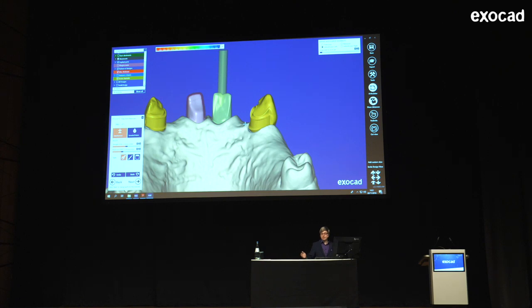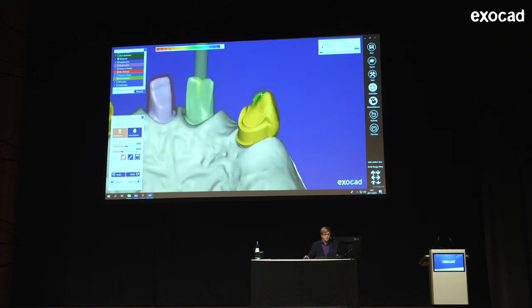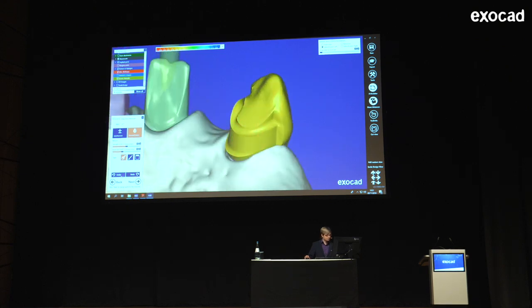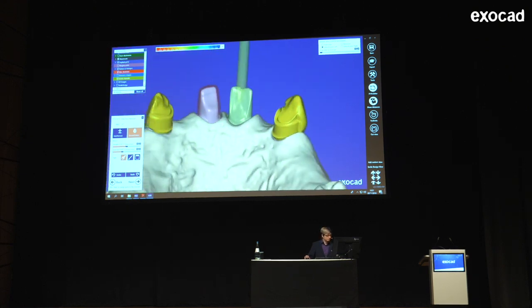Because now I can actually freeform, like in all the telescopic crowns, I could now freeform it, but only the anatomical parts and the ones up here in between the upper curve are activated for smoothing. So I can't smooth the parallel surface. But there's nothing I want to do here now, so I'm just going to the next step.